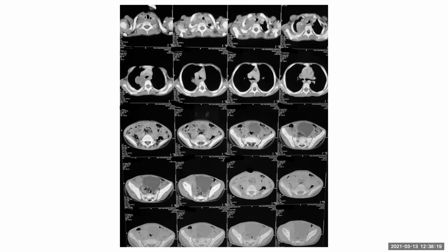I think with the paravertebral calcification, neuroblastoma is the primary differential I'm thinking of in this patient, or with multiple metastases along the sympathetic chain. An MIBG scan would be indicated for further staging of this patient. This is the spiculated periosteal reaction, as we saw in the previous case. The neuroblastoma of the left suprarenal region also had this spiculated periosteal reaction and metastasis in the iliac bones.